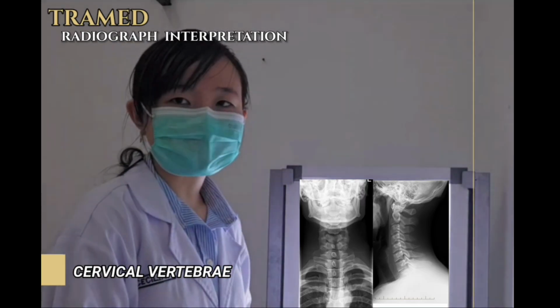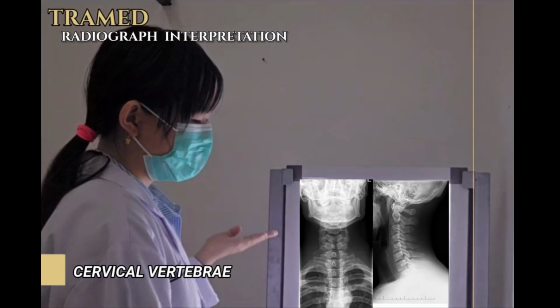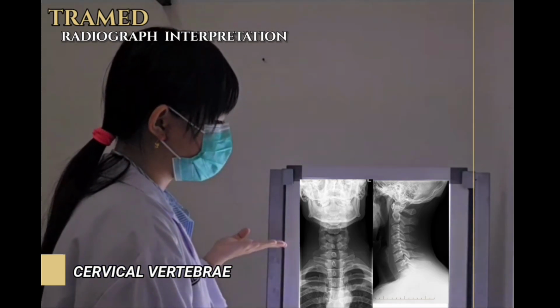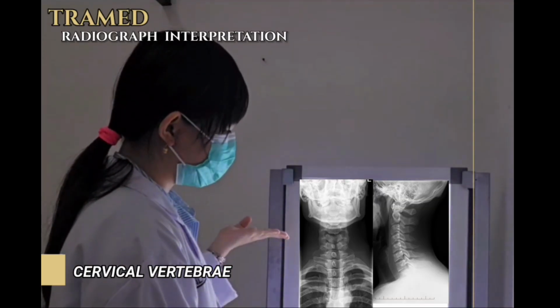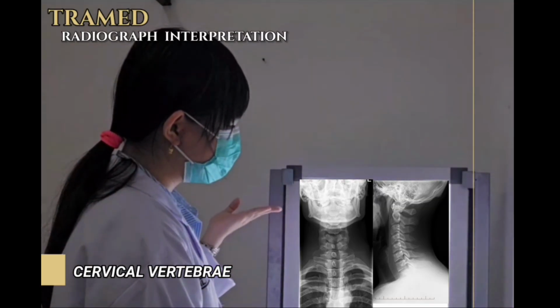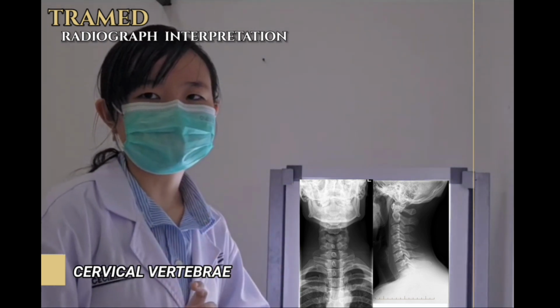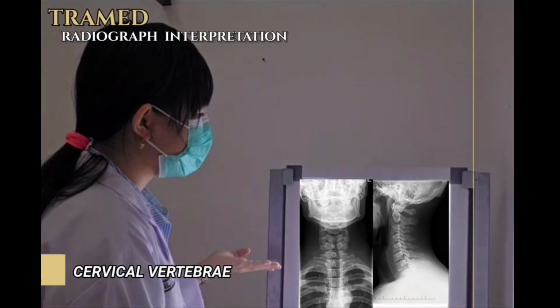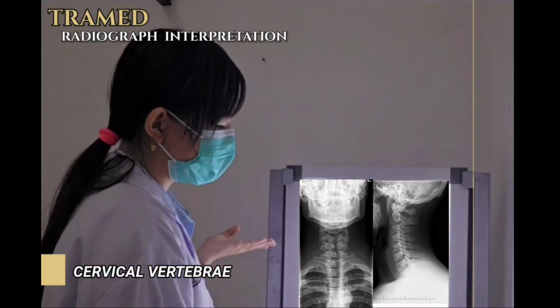And the next, we must check the findings, the cervical AP and lateral. The first, the cervical vertebrae are visible, C1 until C6. It's normal. The cervical curvature is normal. There is no listhesis. The listhesis is usually anterior or posterior, but in this image there is no listhesis. And for the next, the bone integrity is intact.